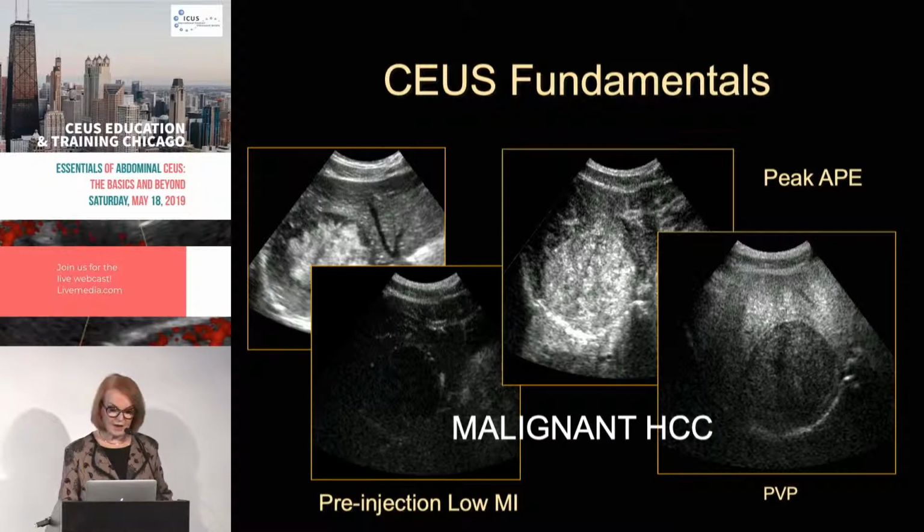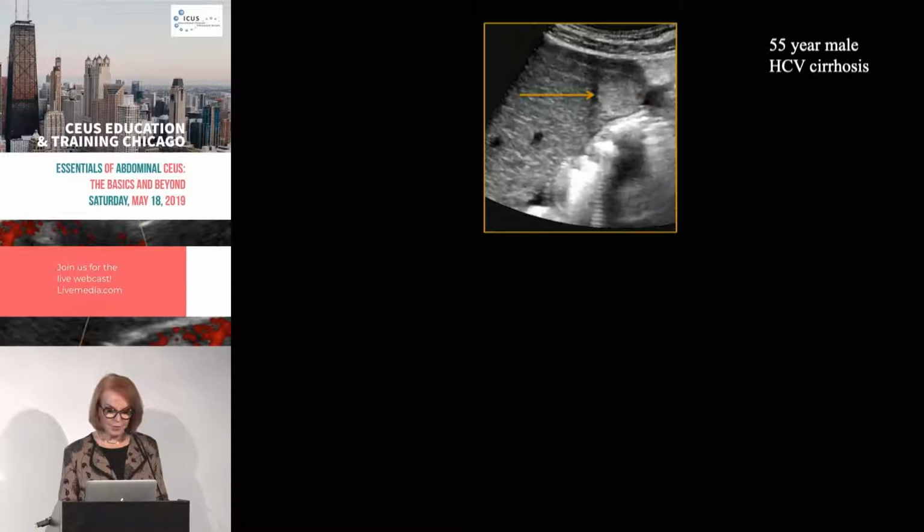And so as Richard had mentioned to you, that observation of washout, it's not 100%, but overwhelmingly, as soon as we see washout, the first thought that comes to our mind is, this is a malignant mass. So lots of information. And again, this is on an old scan from the year 2000. And so I'll just go past that.